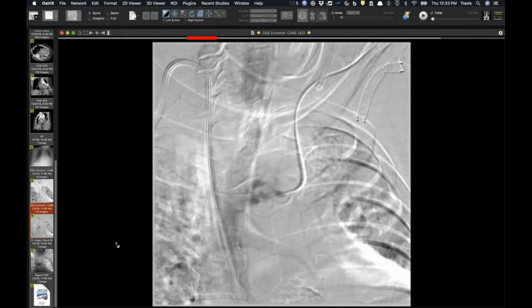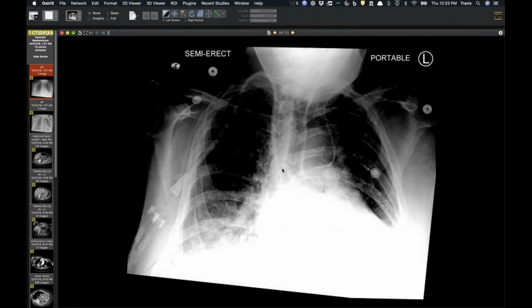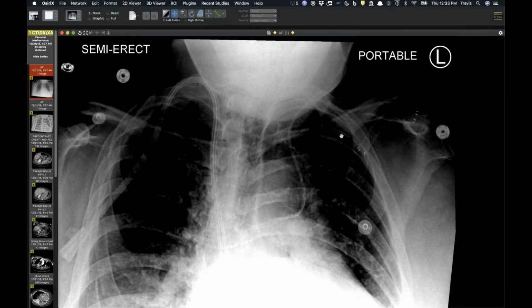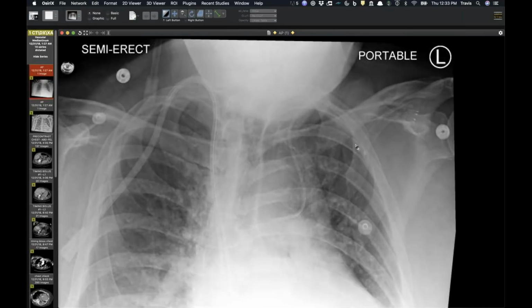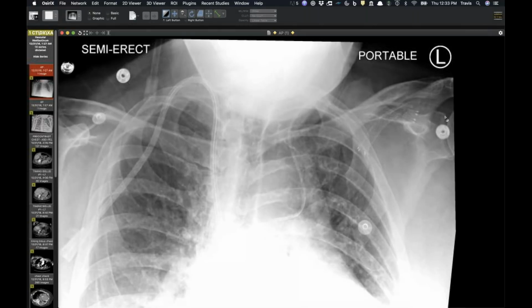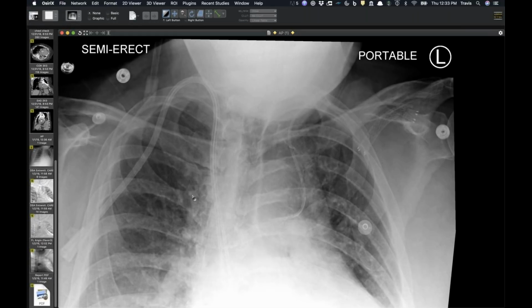Can you bring up that initial radiograph, Travis? Can we zoom in? Can we actually see that it is a multi-lumen catheter? No, you can't really tell. It's not a very large caliber catheter, of course. Actually, yeah, you can see right here it is a triple lumen, because there's this little plastic triangle, and you can see probably the different small caliber ports there. But it's not like a tunneled large bore dialysis catheter like this, where you see separate ports there. But yeah, so partially extravascular catheter.